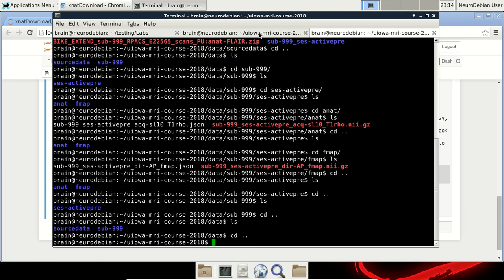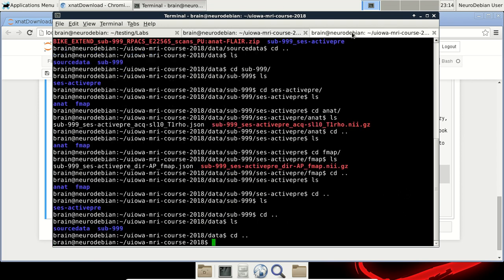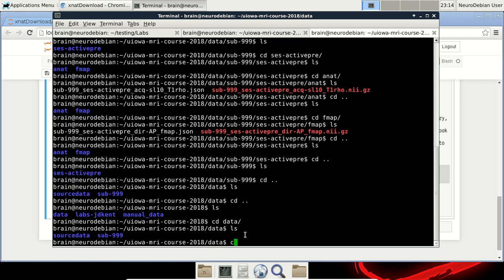And this will eventually chug through all the data that we need. It will still take a while, but eventually it will convert all the data, and then we can start our analysis. So checking for data quality.